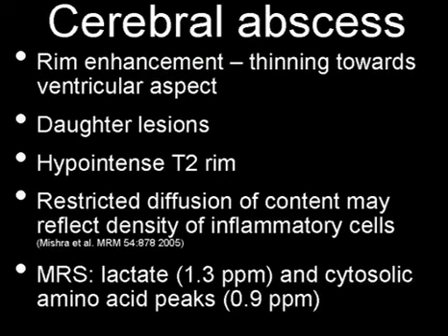But are there additional MR modalities that we can use to further help us out? Well, we can take a look at diffusion-weighted imaging, and what we'll expect to see is restricted diffusion within the content. Now, conceptually, it would seem as though an abscess contains a lot of purulent material. It's thick and it's kind of cheesy necrotic stuff, and so that's why you have restricted diffusion.